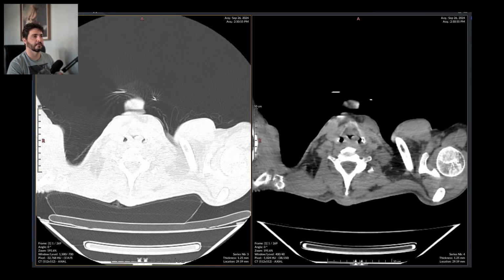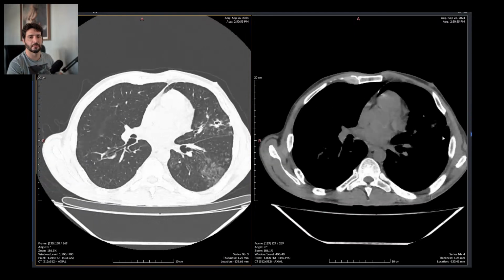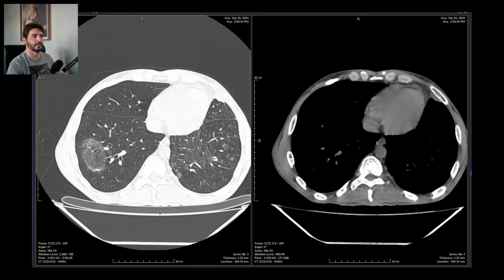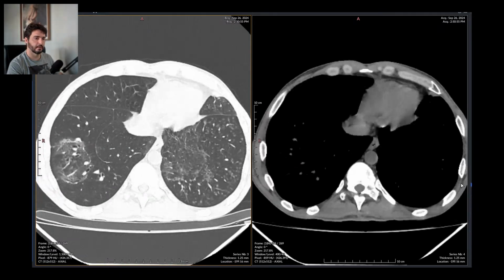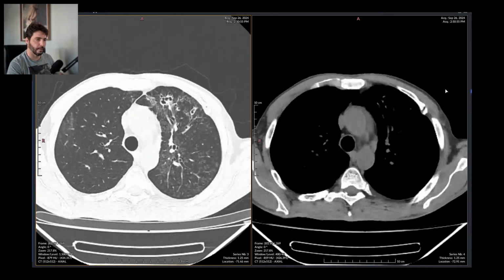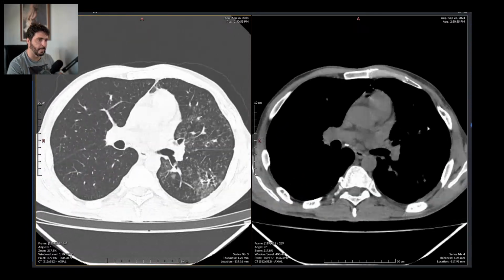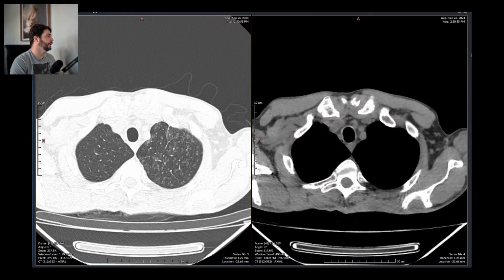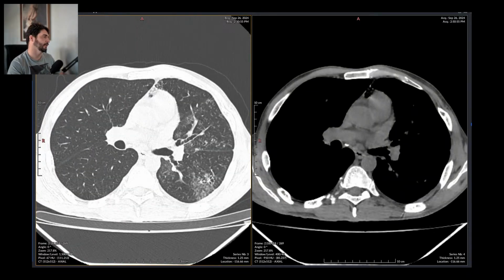Just good old keyboard and radiologist typing those very fancy words in the report. Right there, I have a template for this, of course, as always.